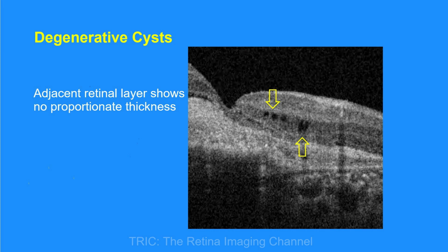We need to remember that these cysts do not indicate an activity, they are just a result of degeneration, and they are not exudative or intraretinal fluids.